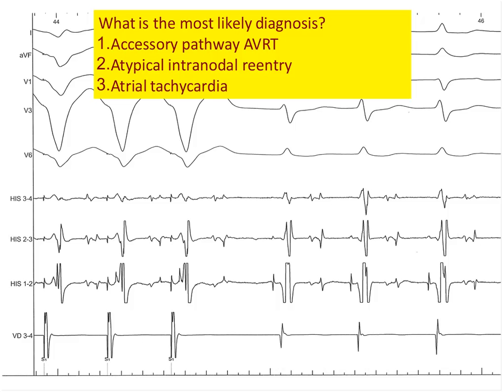What would you think? I want you to vote now. We don't have a lot of time, so I think we have to be fast now. Can you please vote? You can measure the PPI in relation to the tachycardia cycle length, or you can measure the VA interval during tachycardia as compared to the VA interval during ventricular pacing. You could now vote, I think.